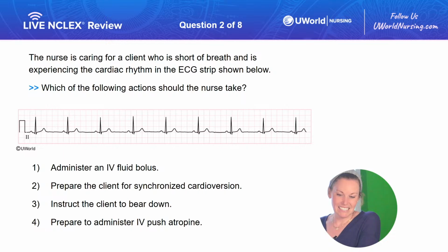All right. Good work, you guys. I'm seeing a lot of option 4, some option 3s. Let's see. Good work, you guys. All right. Awesome. And again, if you guys are just joining, we're covering ECG strips. We'll have this available on demand when we're done, so you can go back and take your time, go through these and practice more. Or if you missed any questions, you can go back and see the questions you missed.